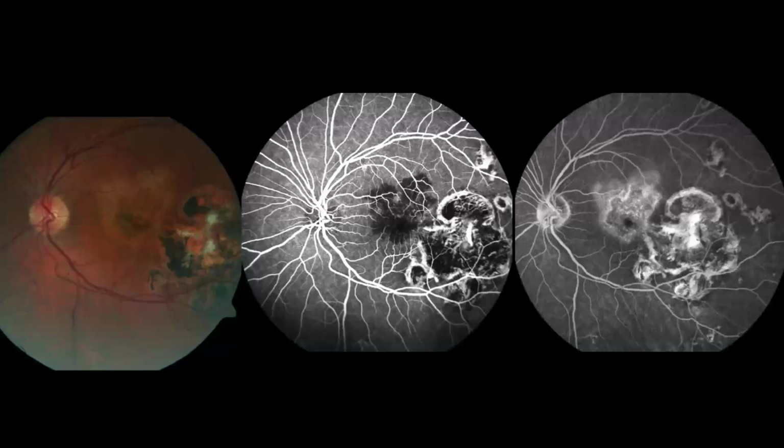So we see the fundus photo on the far leftmost photo. We see the fundus photo of the left side with clear media, distinct borders, cup-to-disc ratio of about 0.4. We note in the macula and also in the temporal periphery that there appear to be patchy plaques with a mix of hyperpigmentation and also absence of pigments in some areas as well. In the fluorescein angiography, we see good disc fluorescence, good filling of vasculature.